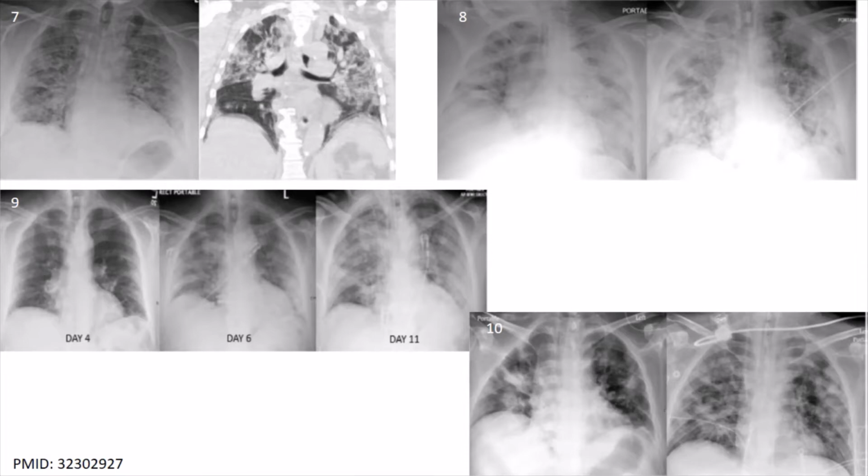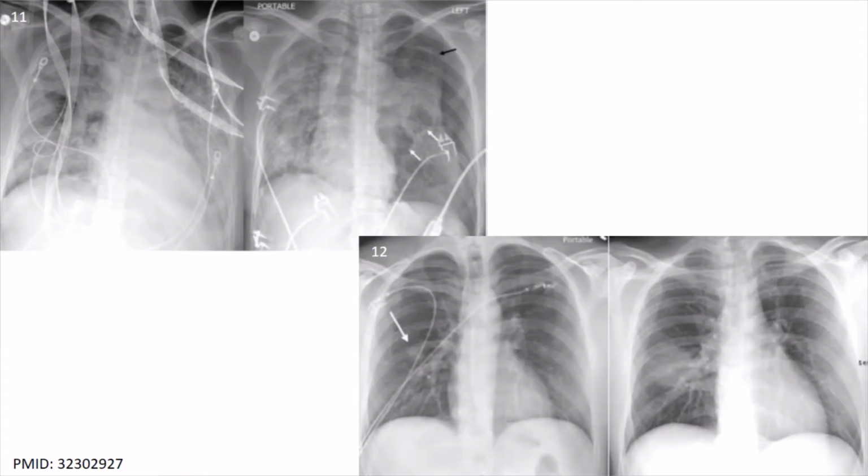8. Lung opacities may rapidly evolve into a diffuse coalescent or consolidative pattern within 1 to 3 weeks of symptom onset, often peaking at around 6 to 12 days after initial clinical presentation, see Figure 9 and 10. Lung cavitation and pneumothorax are also rare findings in COVID-19 patients but can occur, see Figure 11. Localized large nodules have yet to be reported in the literature to this date, see Figure 12.